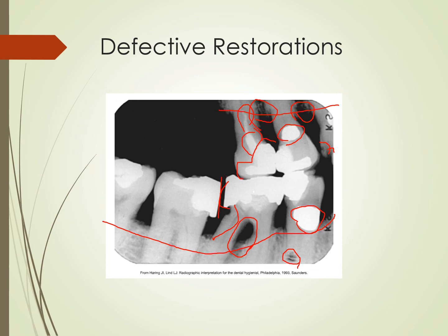So they're very flat, and it's very important that we get this nice contour to a tooth, right? We need that curve. We like curves here in dentistry. So the examples we're seeing are uneven marginal ridges around some of these teeth. We see open contacts, this big old honking space right here. We see overhangs like this one, and we see poorly contoured restorations, because it's so flat. We need curves. And yeah, this patient is not in good shape.